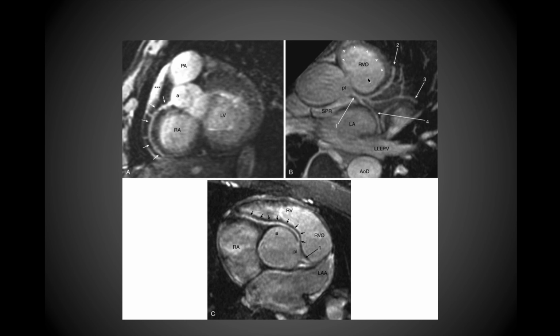And so obviously this is going to be the right ventricle up here, so that's where that one is traveling to. And then the one that's coming around this way is going to be the left circumflex artery that's looping around the posterior aspect of the left atrium and supplying much of the left posterior aspect of the left ventricle. And then down here, this is a little bit of an anatomical variant based on where the 2 arteries are coming off.